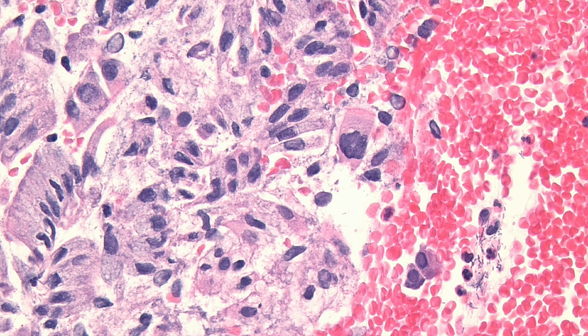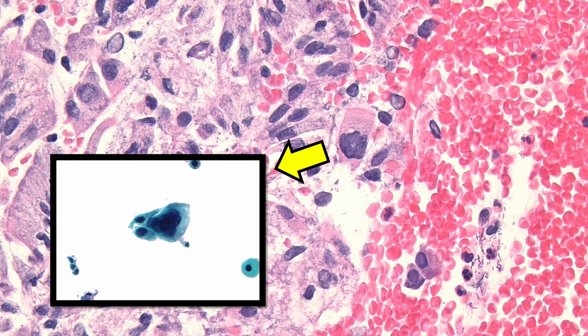Reactive forms can also be noted in the endocervical curettage specimens, including nuclear enlargement and focal multinucleation, which you can see in the center of the photo there. Drying artifact is also often present and must be interpreted within the context of other cells within the specimen. These are important changes to note on histologic section, as they can also show up on pap smears. This is a multinucleated endocervical cell, similar to that noted in the curettage specimen.